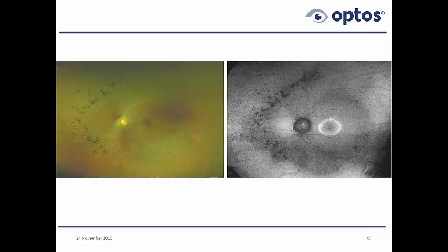The more interesting factor of this one is this bullseye. This we're not seeing with the color imaging. We're not seeing it with a standard ophthalmoscope, but over here we can certainly see a bullseye maculopathy. So bullseye maculopathy is very common in retinitis pigmentosa or in cone dystrophy or inverse RP, and as I mentioned before, in Stargardt's disease as well. That's all in addition to the toxicities such as Plaquenil and Accutane.